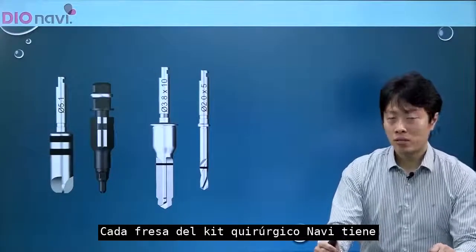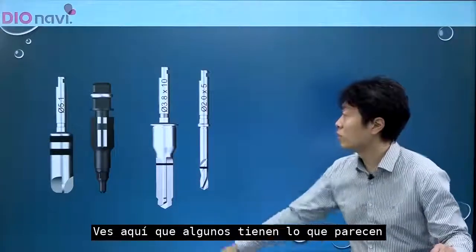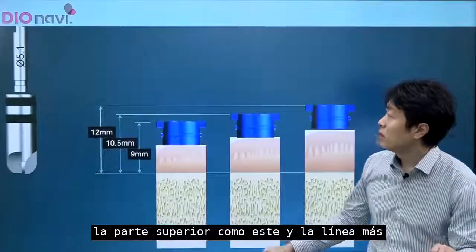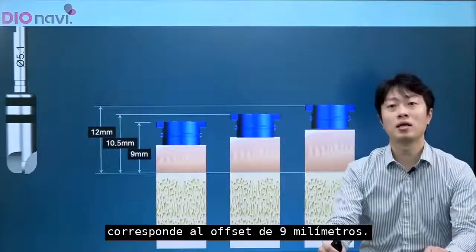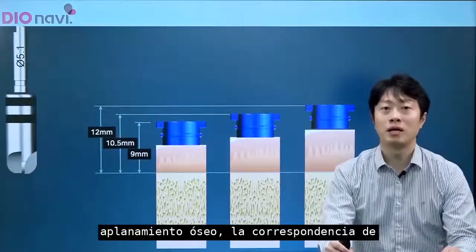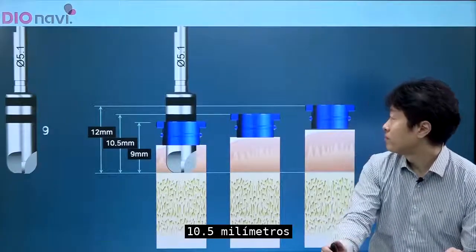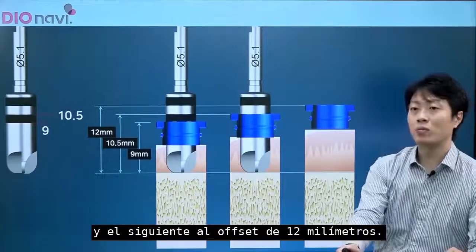Every drill in the DIOnavi surgical kit has a baseline marked. You see here, some have what look like bands. There's also a drill with a stopper on the top like this, and the lowest line of most drills corresponds to the 9 millimeter offset. Let's first look at the drill called bone flattening drill. The lowest marking corresponds to the 9 millimeter offset, the next one to the 10.5 millimeter, and the next one to the 12 millimeter offset.